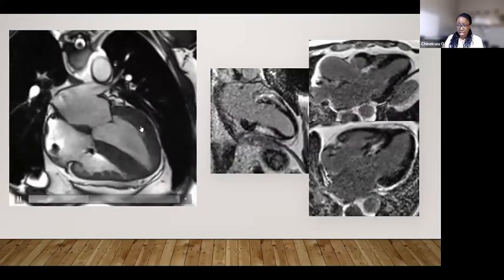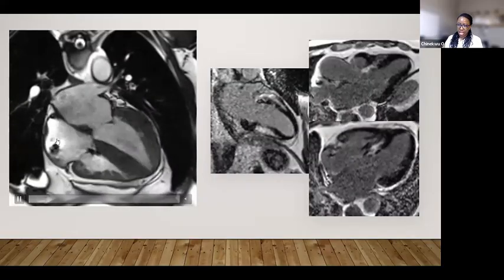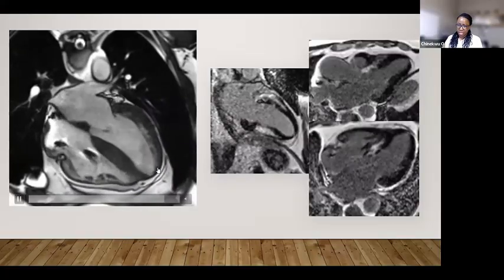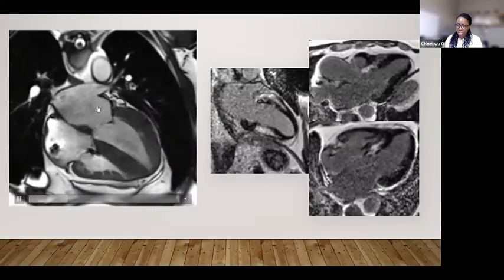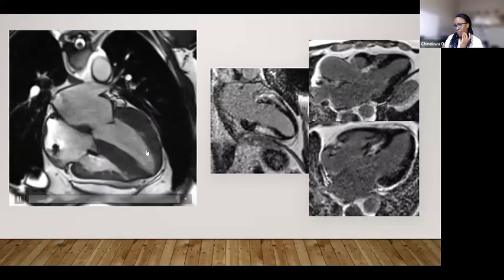He then has his cardiac MRI. We can see the sinus rhythm at that time. He had an ICD implanted because he was so rhythmically unstable. We can see that we have normal chamber sizes. Function is definitely not normal, but is mildly impaired, 45 to 50%.